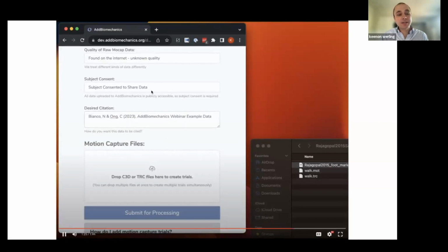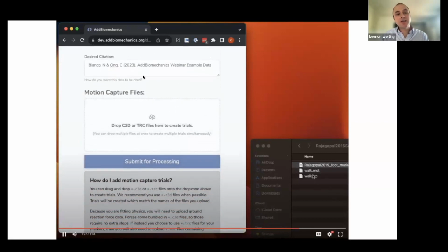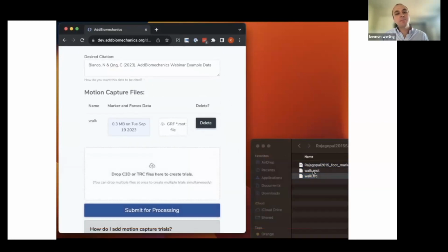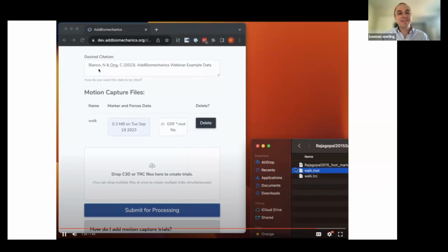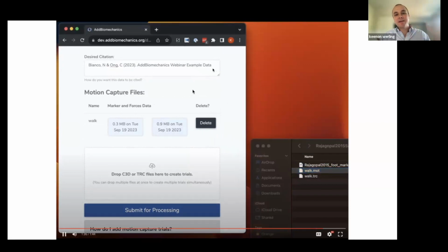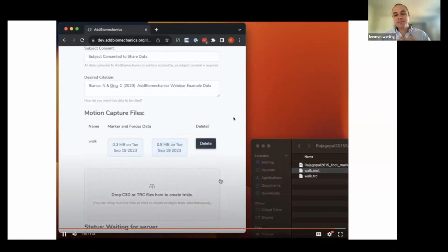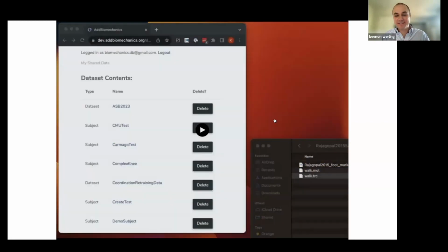We require subject consent, and then you can add a citation, and you can put whatever you want here. Please, please do not put any PII data in the citation. Don't say Keenon Werling's mocap data from 2020 if I'm the subject, unless your subject explicitly asked to be cited in the use of the data. And that last step there is to just hit the process button, and then it runs.